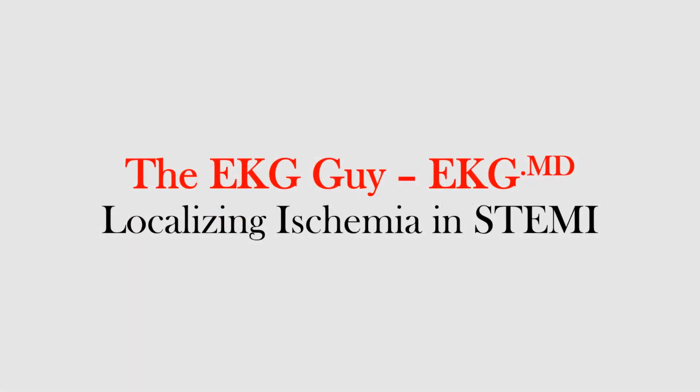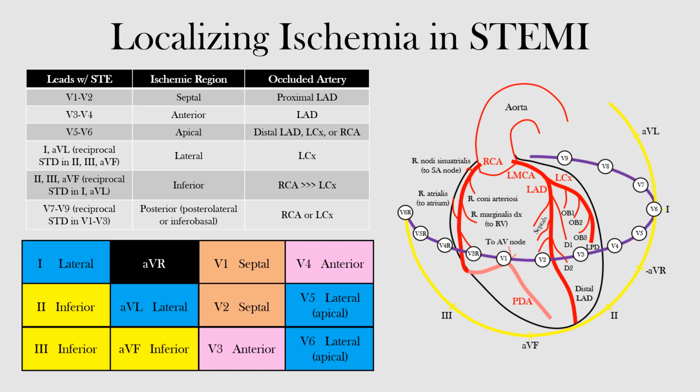In this lecture, we will discuss how to use the EKG to localize the ischemic region in ST elevation myocardial infarction. Up to this point, you should have a good grasp of the EKG progression during myocardial ischemia, along with what constitutes true ischemic changes. We now want to not only recognize these ischemic changes, specifically ST elevation, but also localize these changes on the EKG to specific regions of the heart and the potential artery involved.